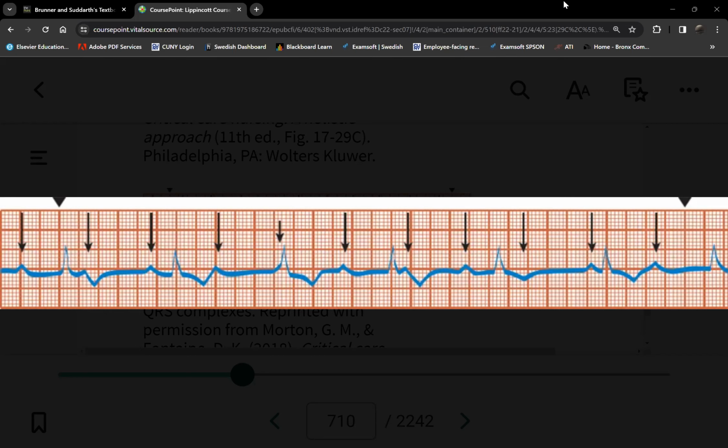Let's look at the P waves here. Start with this one. P wave. That's it. It's not as easy. Let's start here. P to P. P to P. And we don't have a P there, but we have 2 P's here. Okay, so P to P, occurring about the same time, right? And we don't have a P there, but we have one here.